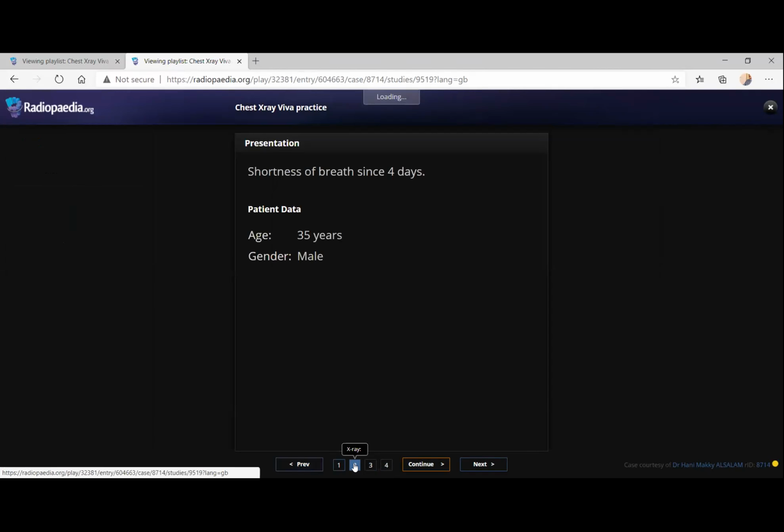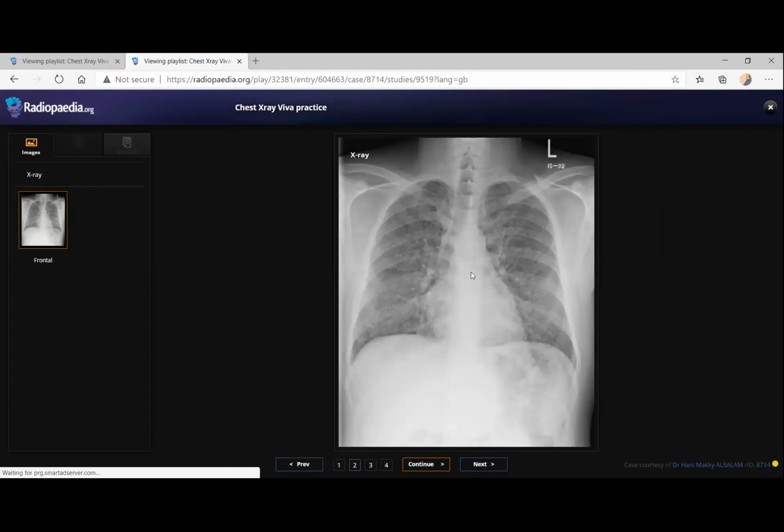And this case, actually, these are mainly alveolar and interstitial opacities both together. So you have to tell different scenarios. This is a non-specific finding because it's a differential diagnosis case, so you cannot say a diagnosis straightforward. The examiner is looking at how you are telling the differential diagnosis. It can be due to typical and atypical infection, and if the patient is immunocompromised, it can be due to atypical infection, or it can be due to pulmonary hemorrhage. It can be due to pulmonary alveolar proteinosis, like that. You have to give all the DDs.